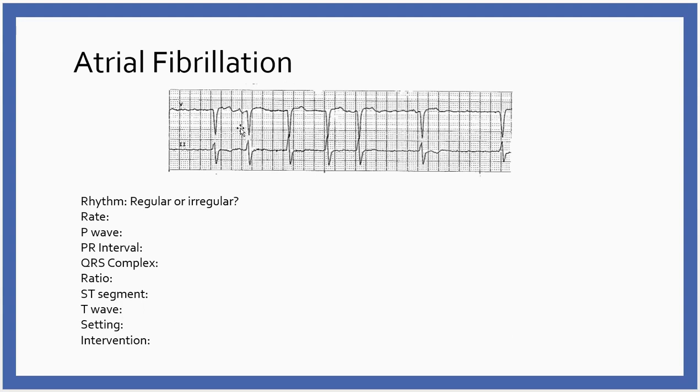But it's important with atrial fibrillation that we pay close attention to the rate. Because the faster the rate is on this, the faster our ventricular response, the less time we have to fill the ventricles, and that'll really impact cardiac output.